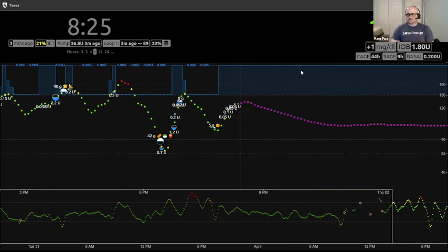So a couple of the pills we want to talk about. This one here is really important. This is the difference between the current reading, 129 in this case, and the previous reading, the one right before it. And again, you scroll back, you can see those as well. So it tells you how fast the rate of change is. Fancy math word is the delta, right? The change between the last reading and the current reading. So the last one was, you can probably do the math there, 128. That's useful. I use it all the time.